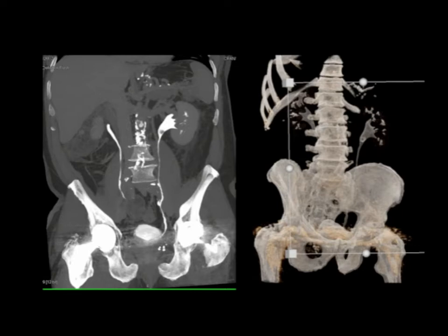If you look at it, I've done the rendering, and then the image on your right is cinematic with a negative type display. It doesn't look like a stone. It's not dense enough. Okay, blood clot is possible, but usually you see more than one blood clot. This patient had hematuria, so it could be a blood clot, but if you look at the negative display, to me it looks like a mass, and this was a transitional cell carcinoma.